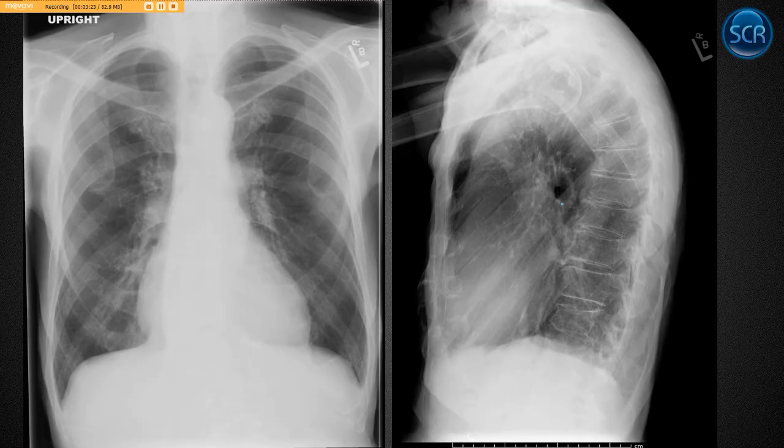Here's an example of someone with emphysema, and you can see they've got flattened depressed hemidiaphragms, they've got a barrel chest deformity, kind of hypertranslucent lungs, and so that's one thing. Okay, so they have emphysema, and the main reason we can tell that is these flattened depressed hemidiaphragms. They should be more like this. Chest should be more like wedge shaped.